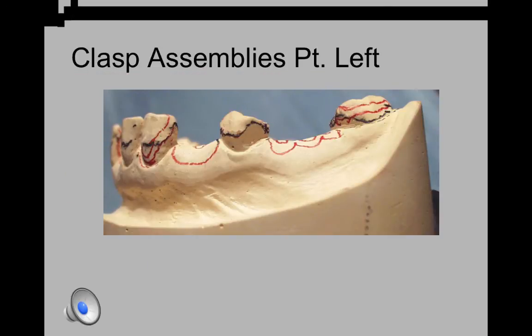A third option is to place your direct retainer on the mesiofacial of the canine. This placement is probably the best from a mechanical perspective, as it separates retention the best and it places retention close to the anterior fulcrum line. But from a standpoint of aesthetics and comfort for the patient, it probably isn't as effective as going back to that first premolar.